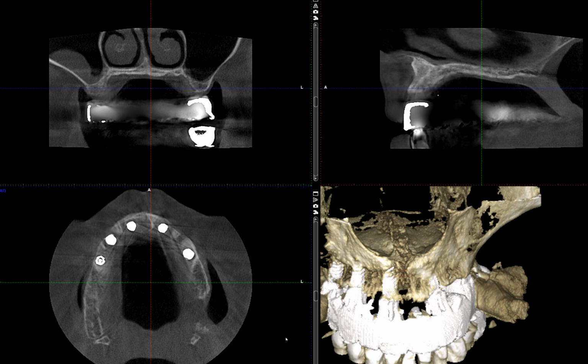Mucous retention pseudocyst can be captured and seen in any of the paranasal sinuses. But in dental settings, since most of our scans will go up to about the maxillary sinus for dental implant cases, you will likely see these in the maxillary sinuses.